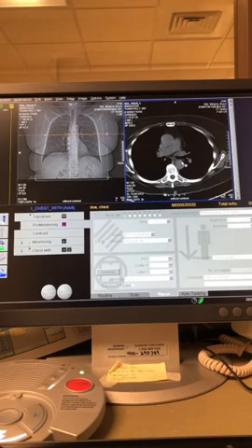We'll take a quick second, because it's important that you recognize each of these vessels. We have our descending aorta, posterior and to the patient's left. We have our ascending aorta anterior here. If we were to scroll up a slice or two, which you can't because it's a single slice, you would see that this is where the arch starts. It comes off the left ventricle, travels superiorly and then posteriorly, and then hooks back to the descending aorta, which goes down and feeds the whole body with oxygenated blood. So this is the ascending, descending.